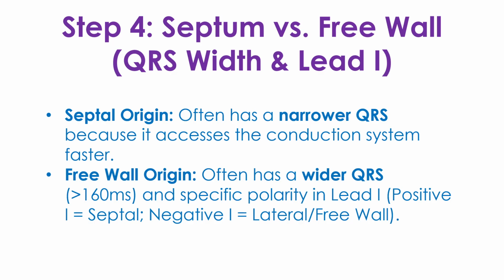Positive in lead 1, likely to be septal. Negative in lead 1, likely to be lateral or free wall.